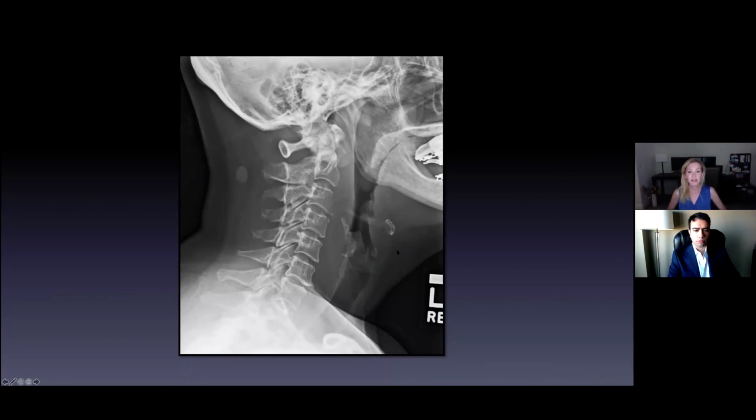This was a 56-year-old woman who had neck pain, who went to an urgent care clinic, and she lived in an underserved area where she didn't really have good medical care. So the doctor at that urgent care ordered an X-ray, and this is what the X-ray looked like. And if you were present at our first session a month ago, Dr. Rasouli talked about the anatomy of the cervical spine a little bit. So you will remember, or if those of you are new, we'll explain it again, that this is not a normal looking X-ray. So this is a lateral view of the cervical spine.